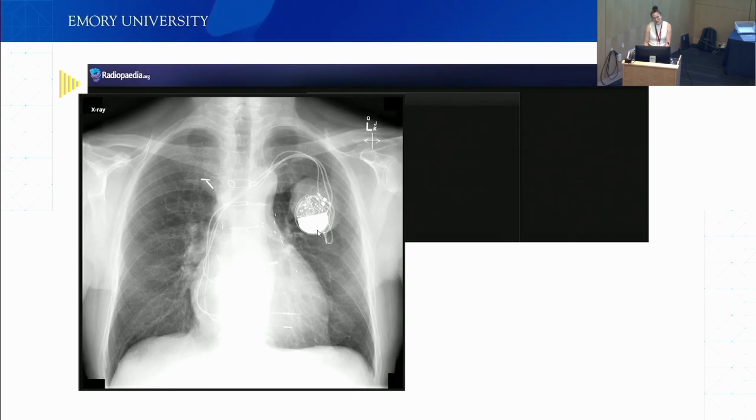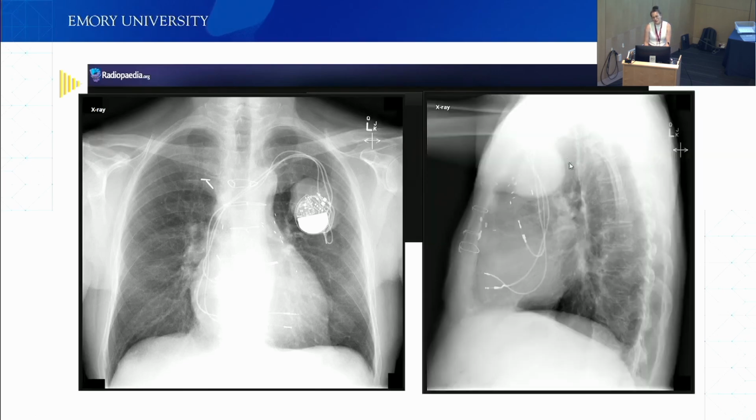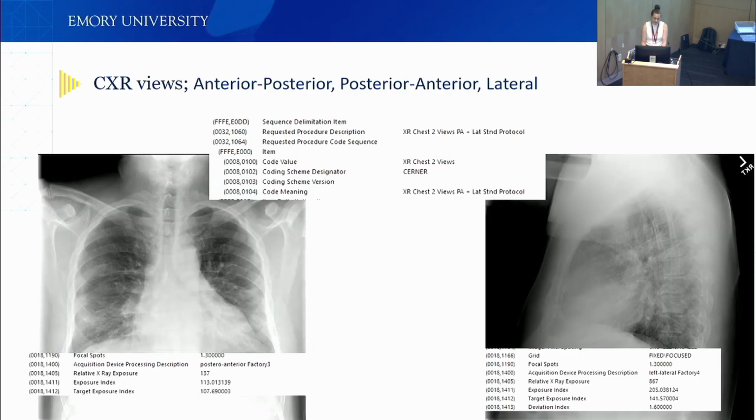There is this shading behind the pacemaker, which is hard to see what it exactly is. In the lateral view, you can see it way better. It's this dome. And again, it's just 3D information makes your life easier, but if you want to use AI, sometimes you will need to give both views, and that depends again on the disease.